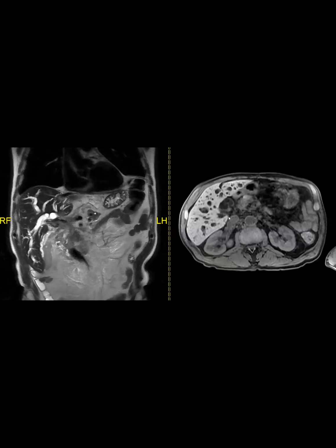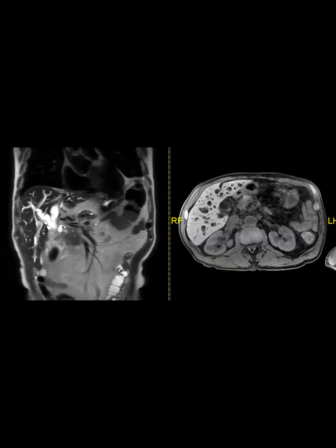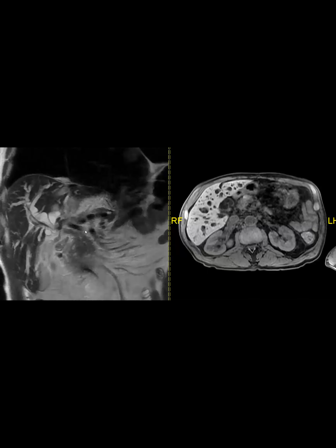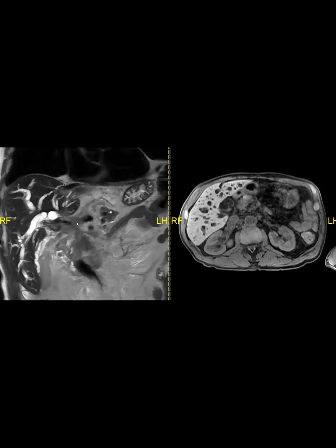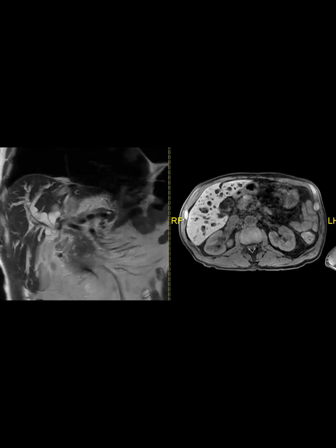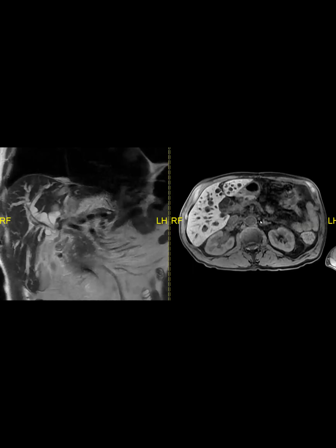Actually, that coronal is really nice to see all the gray around the vessels. I find it helpful with vascular staging on MR to look at the T2. The differential, MR provided, primary versus metastatic, but it's crazy that the portal vein is still going through there. It's still open, yeah. Anyway, I guess we made it. Cool.